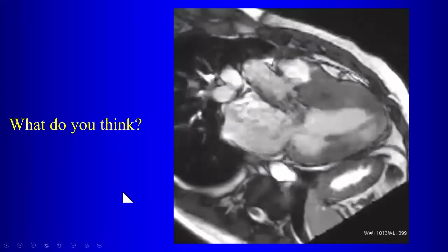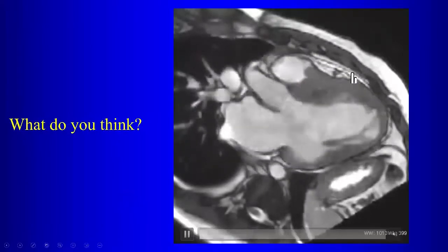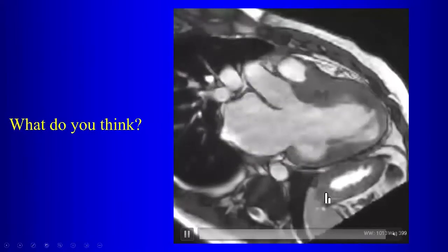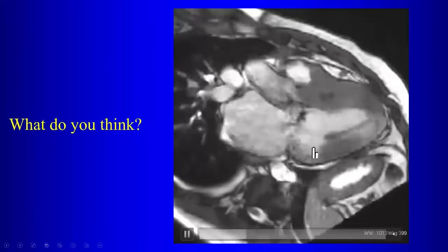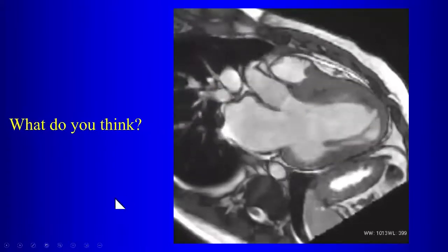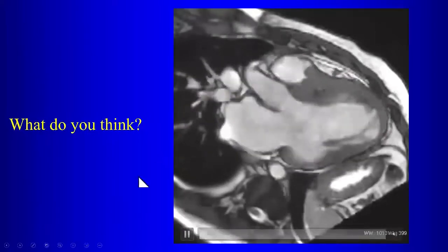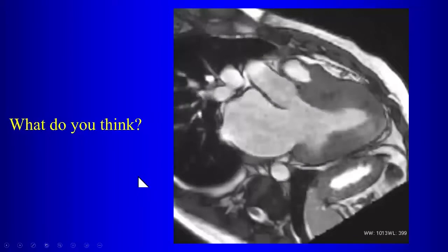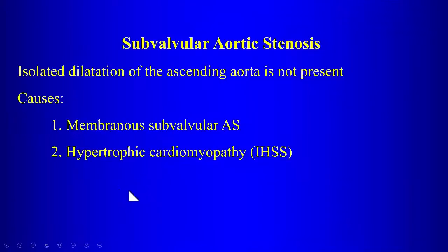Is the free wall supposed to be outpouching like that? Of the left ventricle? No, that's the free wall. That's the other side. Yeah, pericardium. Like right there. Here? Yeah. No, it's not. I mean, it's not outpouching. Look, it's contracting inward. See? Okay. So in systole, if there's dyskinesia, it should go out. This is still contracting inward, right? So you're just partial volume averaging a thinner portion. Okay. All right. So that was HOCM.